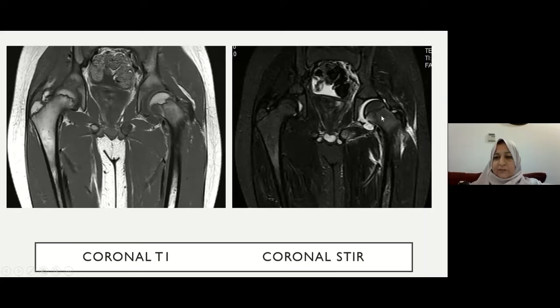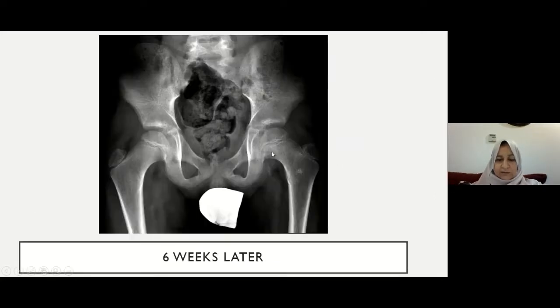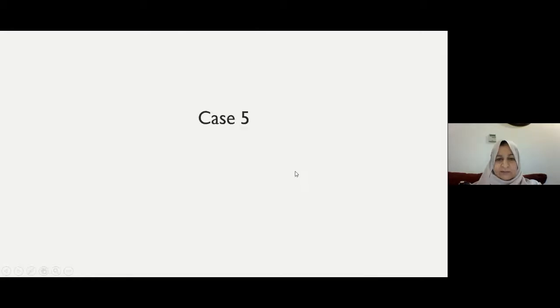What's unique about the proximal femoral metaphysis is that it is an intra-articular structure, so you don't have to have epiphyseal involvement to have secondary septic arthritis. The metaphysis is intra-articular, so it is complicated by septic arthritis. Surgery was done and no long-term growth disturbance or physeal bridges.